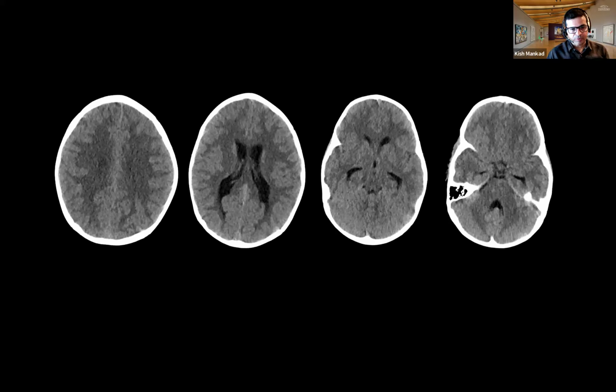Okay, so Hussein is talking about cerebral edema and sulcal effacement. If you have sulcal effacement, I can tell you that in this child you don't see much in the way of sulcal spaces. You have gray-white differentiation preserved. Cerebral edema, you don't have in this case, Abdullah. Hydrocephalus, you're looking at.